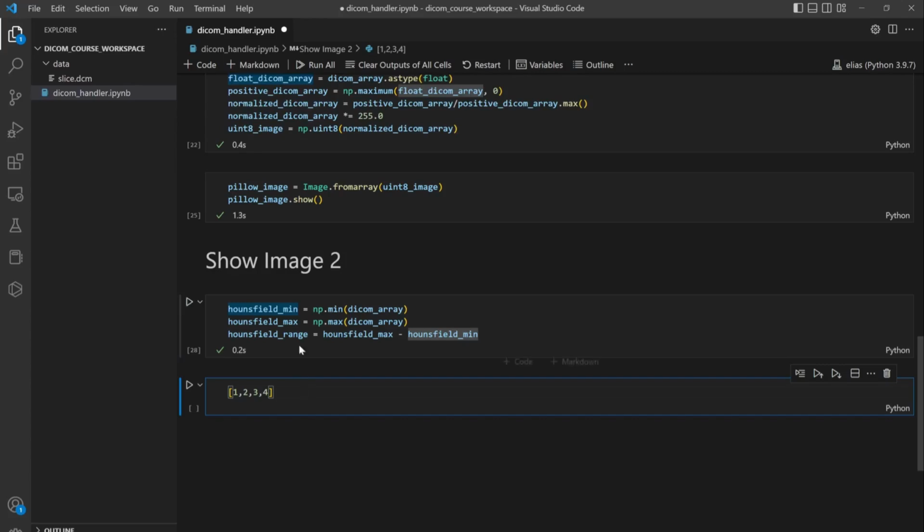For now, since we are using the exact values of the minimum and maximum of the array, it won't change anything. But in the next step, you will see that this is the tricky thing, and this is how you can control the contrast. Now, let me just run it and show you this minimum and maximum thing, what it shows. But after that, I will show you what is the tricky thing to change the contrast.